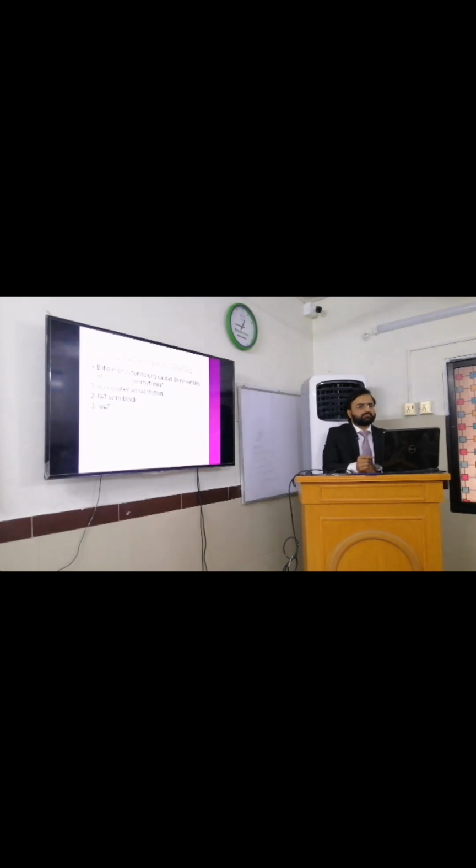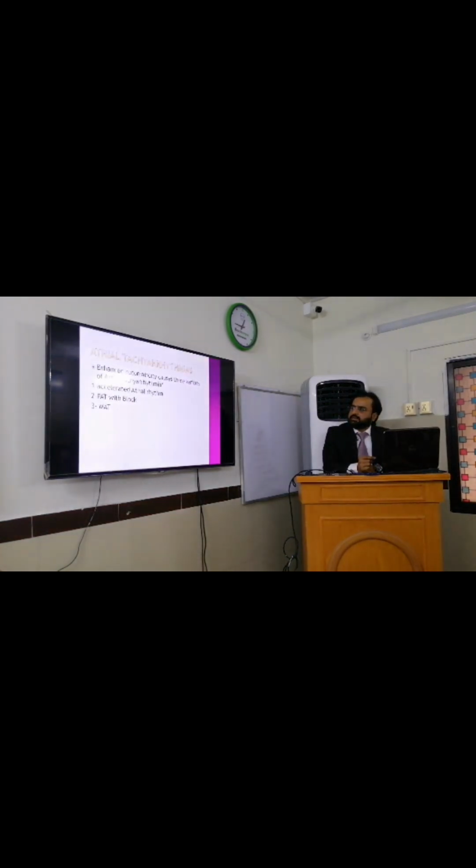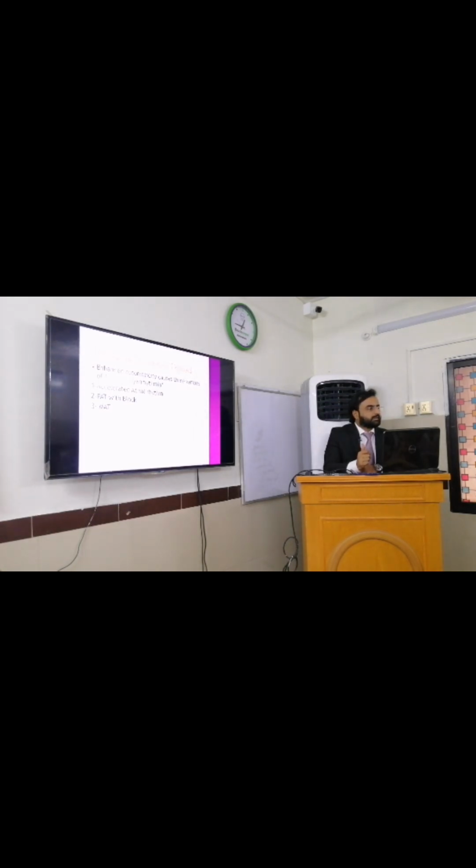That's why most of the time you see certain arrhythmias arising from the atria, arising from the ventricles. So we will be talking about the atrial tachyarrhythmias. As the name suggests, the atria is the focus. The impulse is coming from the atria, right?